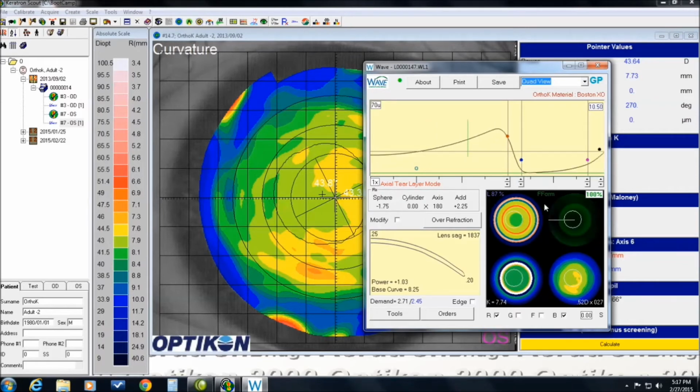And then I'll look at it in freeform mode as I did before, and notice I have a similar effect where it's a little steeper on one side, a little flatter on the other. And I'll raise this up to some degree, letting this area get down to close to about 5 microns, maybe a little more.